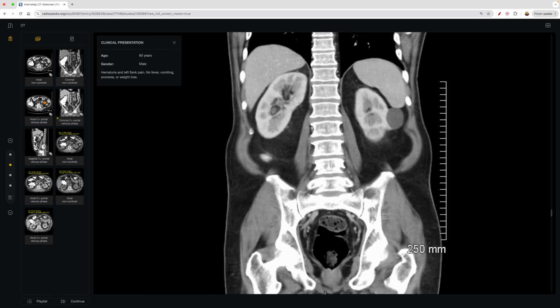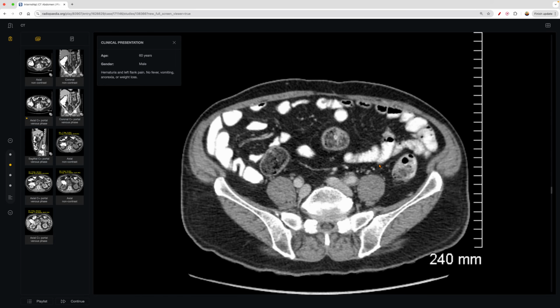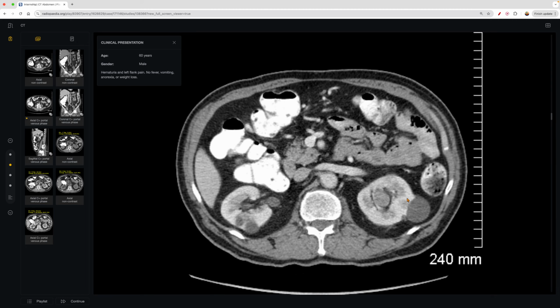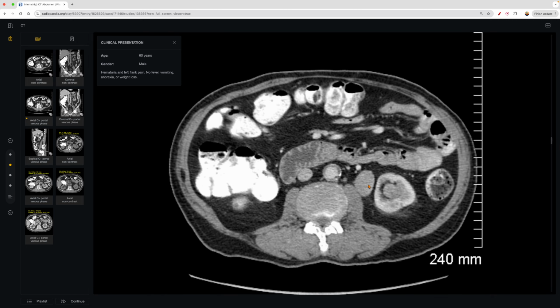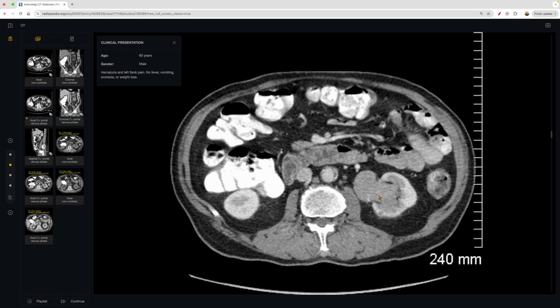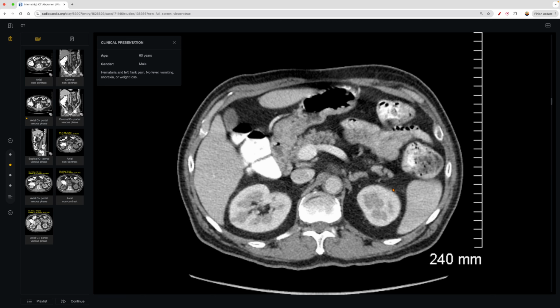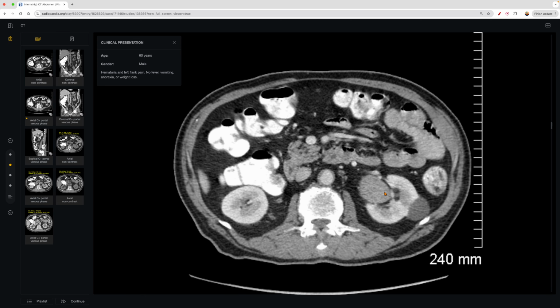And then if we look at the axial view, let's find our kidneys here, go up. And then you can see the cysts. You can see something a little bit more. I mean, this doesn't look right. It looks somewhat lobulated. I don't know, it's got soft tissue density. This doesn't look right. And then you keep going, and there's something else here, right? And this is certainly concerning.